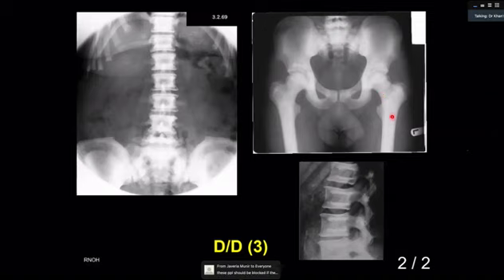And in the diaphyses, not in this particular case, it's not visible, you can get lucencies which are along the longitudinal axis. But at the iliac wings, you will get this arcuate type of lucencies or bone within bone appearance. This is considered quite specific for osteopetrosis.